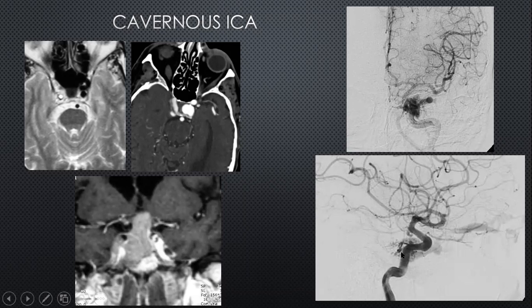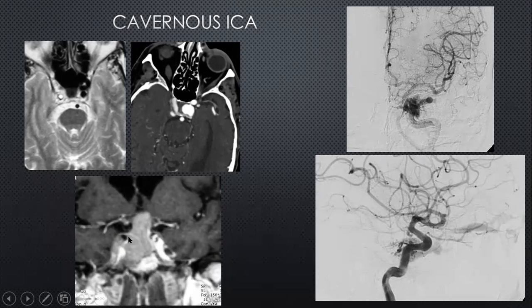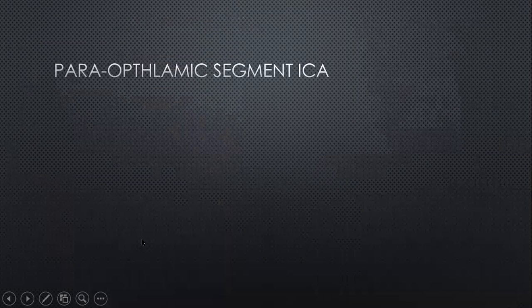For those of you who are interested in skull base and pituitary surgery, you will know the relevance of obtaining routine CTAs and high resolution MR scans to understand the invasion of the cavernous sinus, but also the position of the carotid artery in relation to the tumor itself, and hence the necessity for doing CTA brain lab examination for these patients to understand the anatomy of these vascular structures.